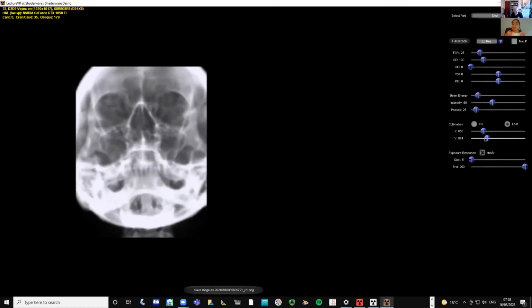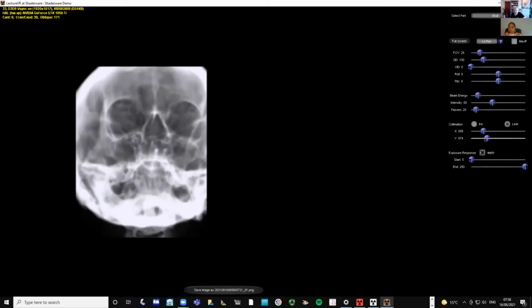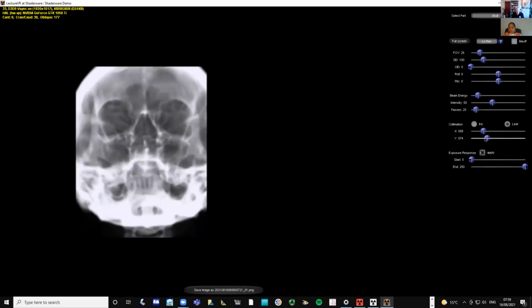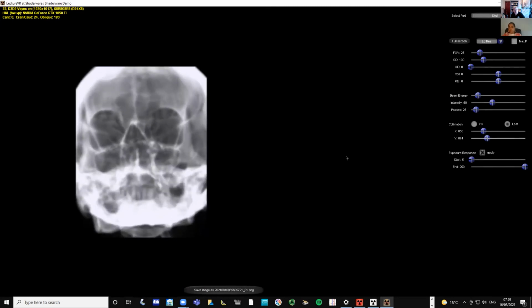And then what you could do is you could say, what about this image? Would you need to repeat that? And then how would you repeat it? And what I've done in the past is I've created an image like this and put that into the exam paper for a 5-mark question and said to the students, explain what's wrong with this image and how you would correct it.